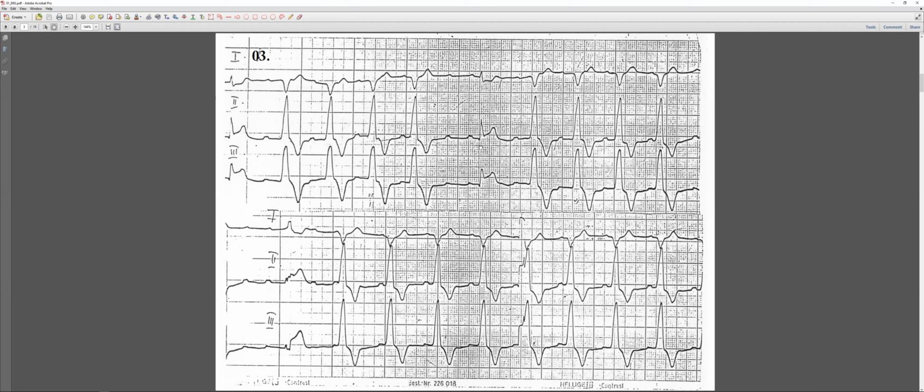How do I know that those are not conducted? We do see a P wave in front of them mostly. But the PR is changing; it looks like the PR is getting shorter. Another thing, if you look at the width, the QRS is wider and the T is inverted. That could show that it is from the ventricle.